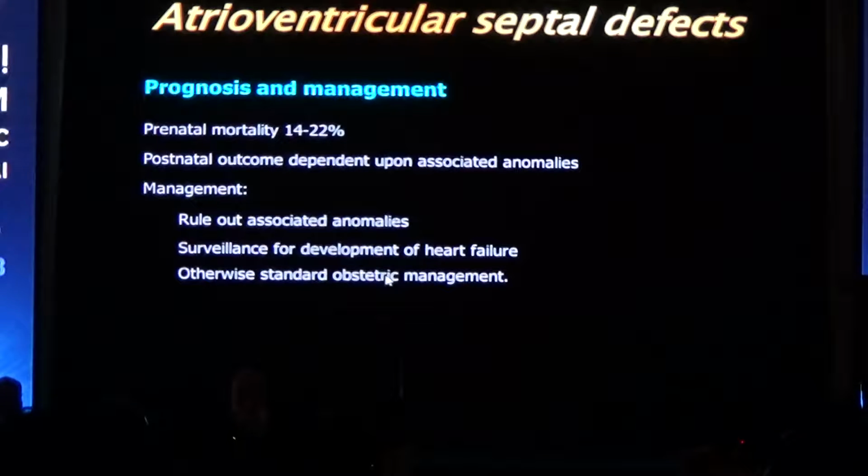So to summarize that, atrial septal defect, two big forms. Ostium primum, you're missing the segment between the foramen ovale flap and the crux of the heart. Ostium secundum, you're missing the foramen ovale flap. For the ventricular septal defect, four forms. The inlet, outlet, and membranous are easy to confuse, but they're easy to differentiate from the muscular or trabecular form. Always do color Doppler to see the transfer of the blood during systole and diastole.